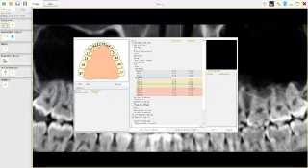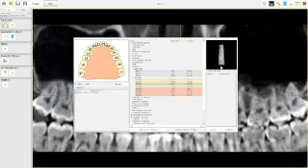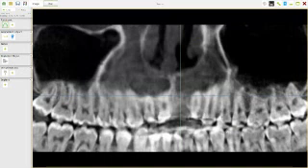And if you wanted you could try and measure it using the system, but it's just as easy to sort of roughly pick one to start with. And then if it's not right, change it later on. So we're just going to click onto that. And when we click onto it, we get this STL file. And this is the 3-dimensional file of the implant. And we want to use this implant. So we're just going to go down to this section here that says validate. So you're going to go onto there, and then we come back to our pan view.